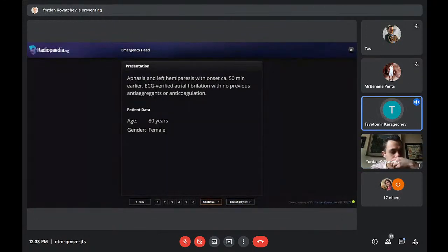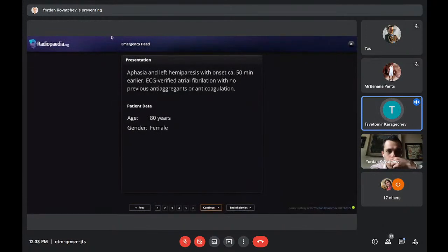So what we do, we don't only interpret images, we always look at the clinical history, we always try to fit the pieces of the puzzle together. And this is actually a great example, because if you don't think about this pathology as a possibility, as an explanation for the patient's complaints, there is a great chance you miss it.